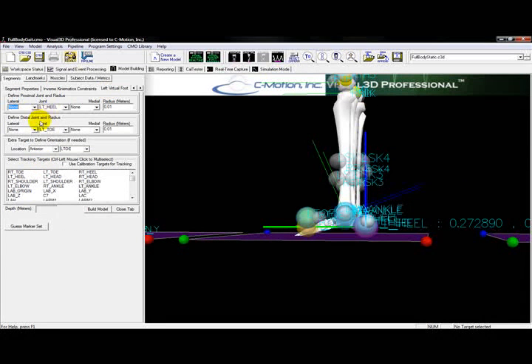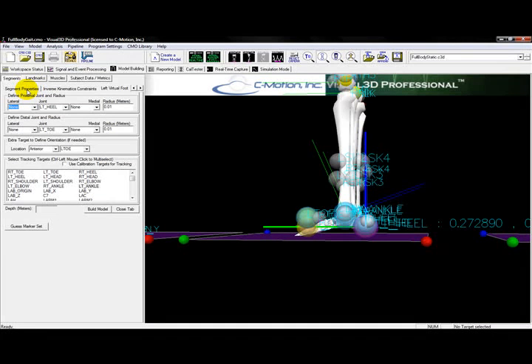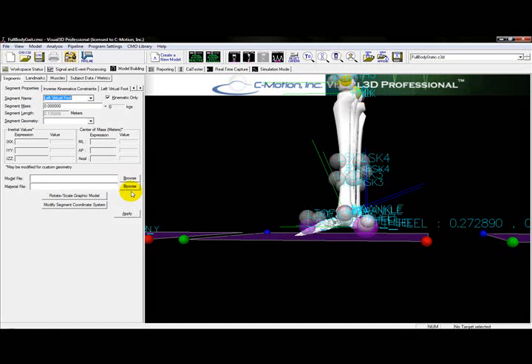Note that the subject's shoes and marker set used here makes the foot look like the subject is on their toes. To see joint angles based on a flat foot, or examine center of pressure, we can create a virtual segment using landmarks as calibration markers. A kinematic-only segment is only used for angle measurements and has no inertial properties or mass. Once the segments are defined, we can compute model-based data values.